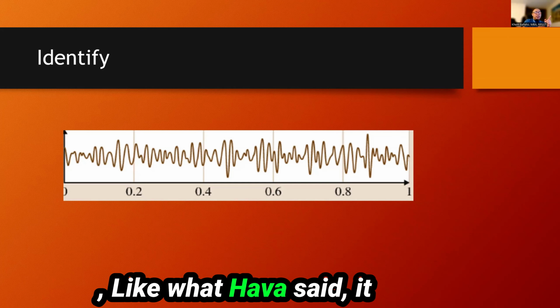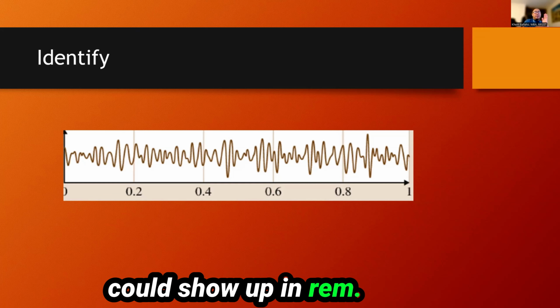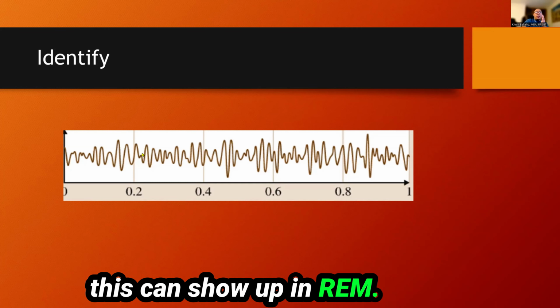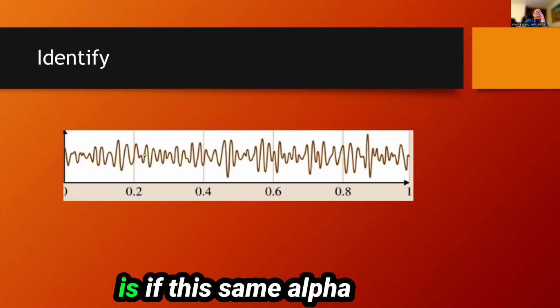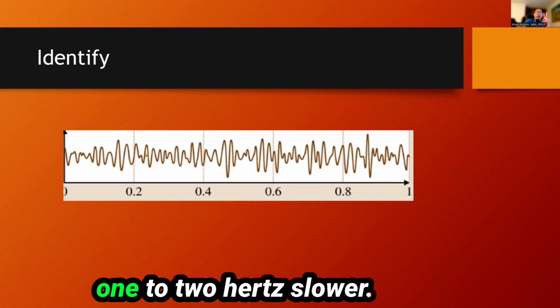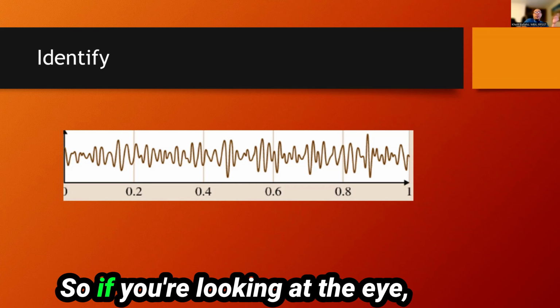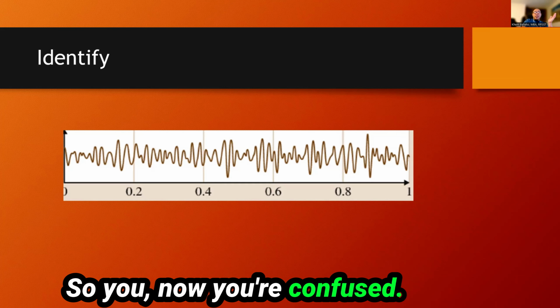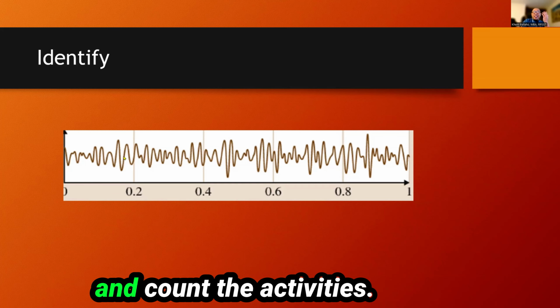Like what Hawa said, it could show up in REM if your wake frequency is 9 hertz. This can show up in REM, and how you can determine is if this same alpha activity frequency is 1 to 2 hertz slower. Okay? So if you're looking at the eye, but then you see some alpha, so you're confused. Just go and look closer and count the activities.